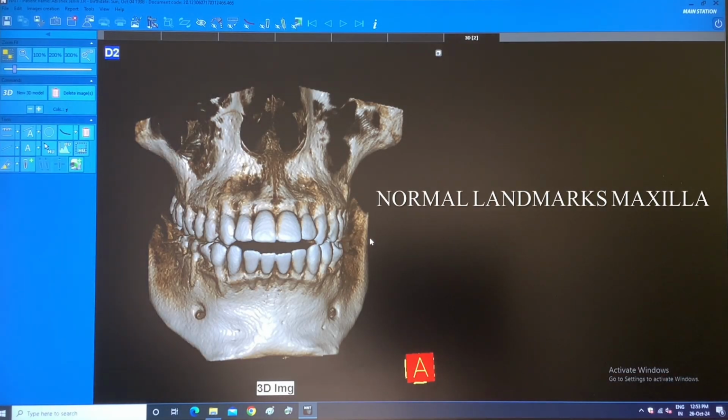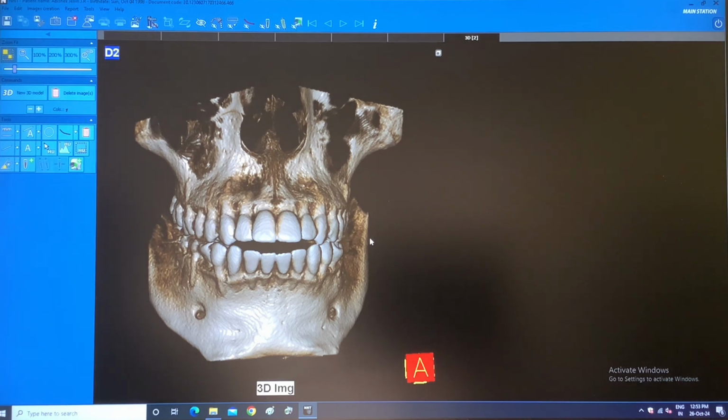We have been discussing many pathologies, implants, etc. in the previous videos. One of the most frequently asked questions is the normal landmarks. So we have traced the normal landmarks in IOPA radiograph as well as a panoramic radiograph. We would just see how the normal landmarks appear in a cone beam CT scan. I would be showing you now the normal anatomical landmarks in maxilla.